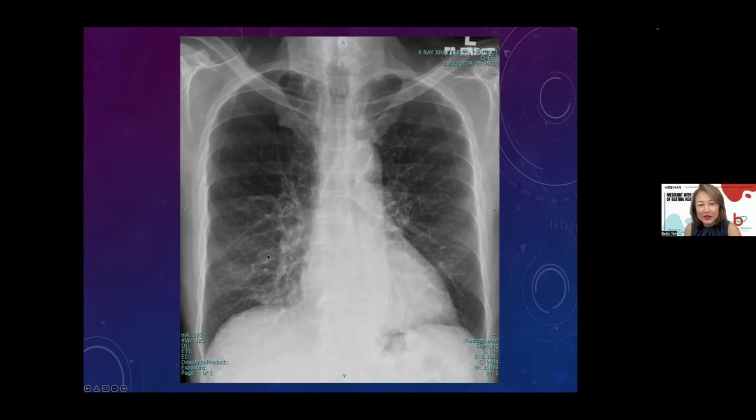Yes, but this one is just a reminder for us to look carefully, because I don't think at first glance I would not miss it also, because I'm retrospectively looking back at this X-ray from the CT. That's why I can see it, but that's the point I want to bring up with this X-ray, just to show everyone we shouldn't miss this area next time when we see an X-ray. Okay. So there's also another nodule here, surrounding this primary tumor. This is a nodule also.